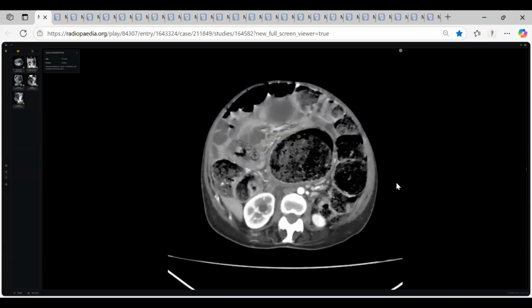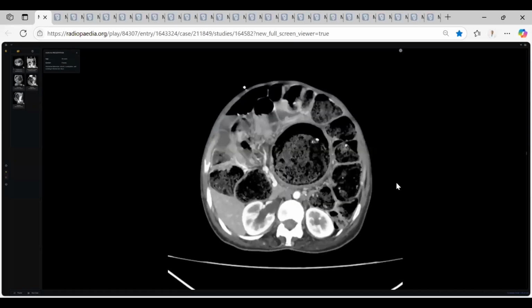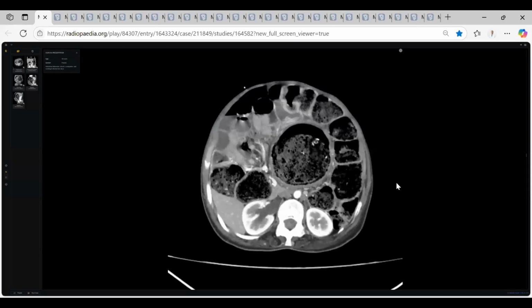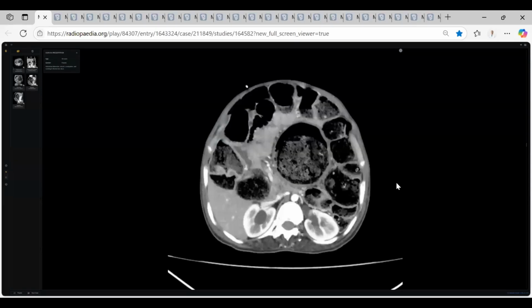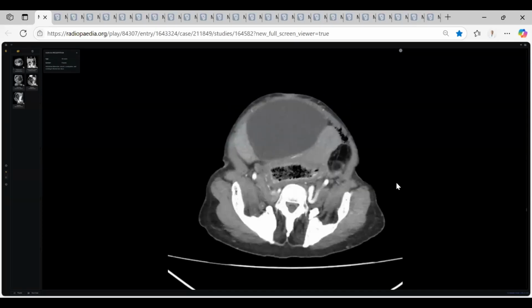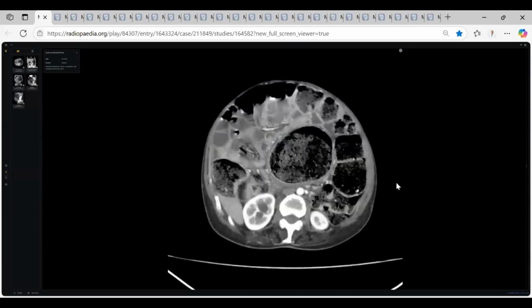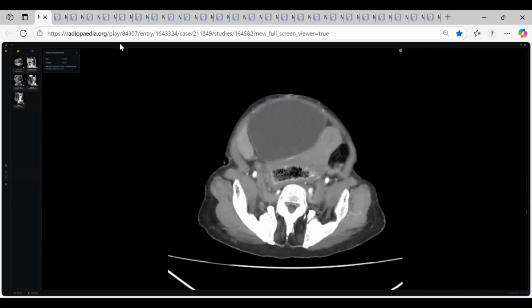Let me help you. Look here. What happened to the right kidney? Hydronephrosis, right hydronephrosis. Okay. And to the left also, the same, left hydronephrosis. What is the cause? The ureters are implicated in this thickening. Yes, excellent. Thank you, doctor, so much.